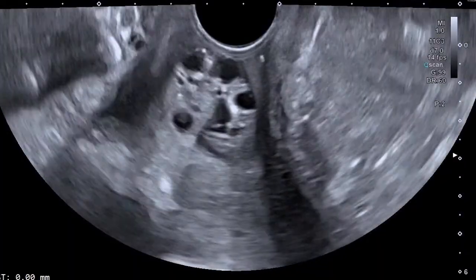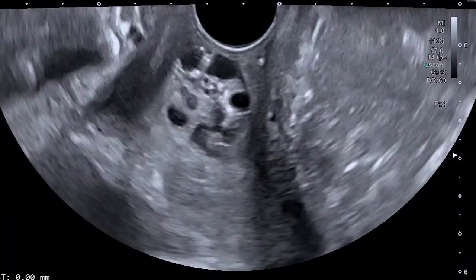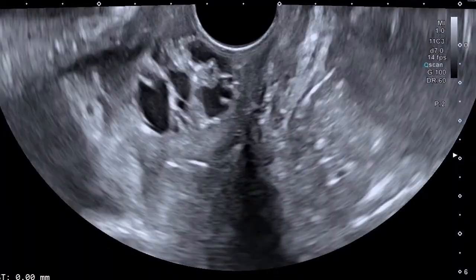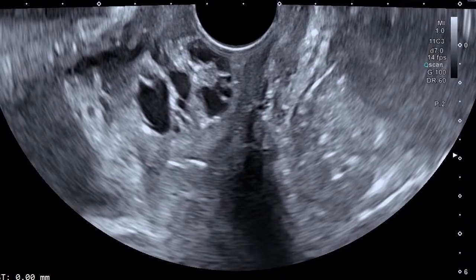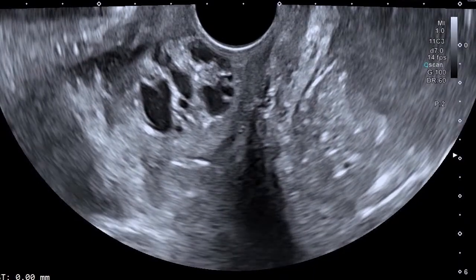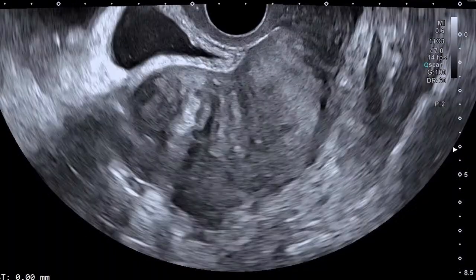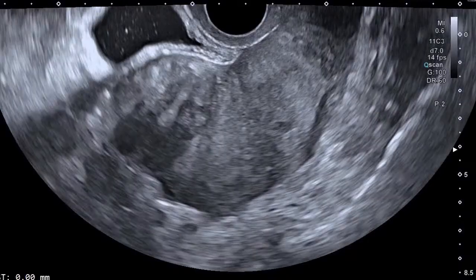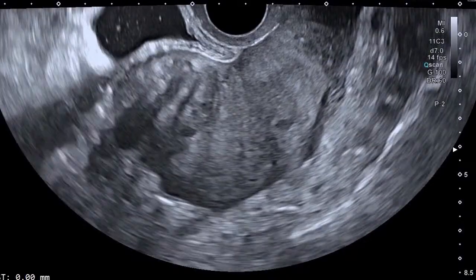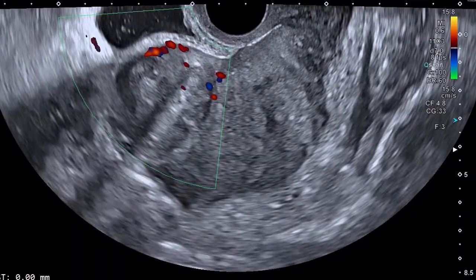You can see it has cystic components, cystic areas like that. What do you think this thing is? So let's do it together. This mass with the honeycomb structure, mixed solid and cystic portions like that. What is that? I need you to brainstorm on it.